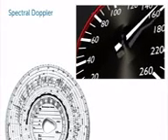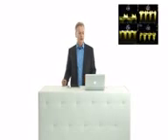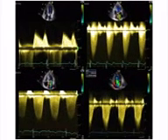In the imaging primer, we already showed you spectral Doppler, where we are able to trace the velocity over time, similar to the way it is done, for example, in trucks, where we track the velocity over time on this little disc. The tracings we use in echocardiography look a little bit different. Now we can measure the velocity across the different valves. For example, here we would have the signal of mitral inflow. This is mitral regurgitation. Here we have tricuspid regurgitation, and this is aortic stenosis.